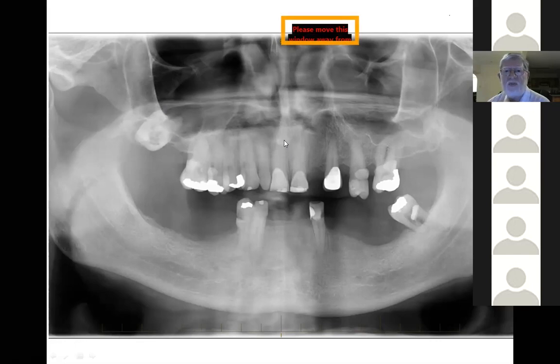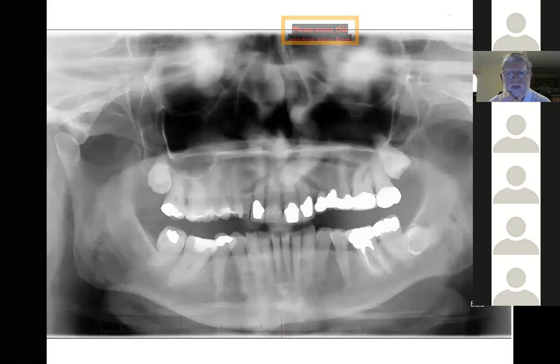I'm not sure about the mesodens in that area. And somebody said about a canine next to the orbit, but the canine sitting here, yeah. Okay, so again, we've got an impacted tooth, but here we are. Here's a tooth completely buried, still covered by bone, and starting to undergo this internal resorption.